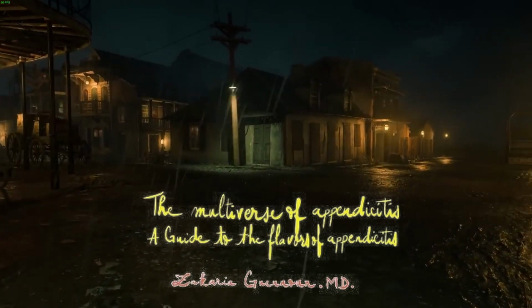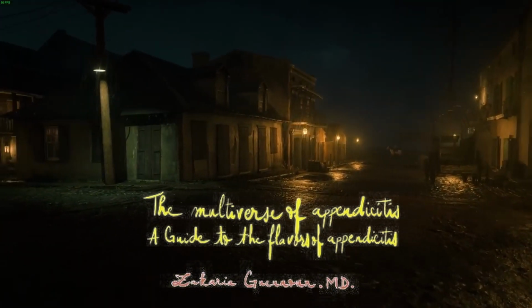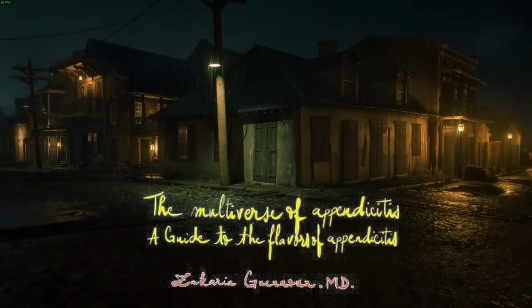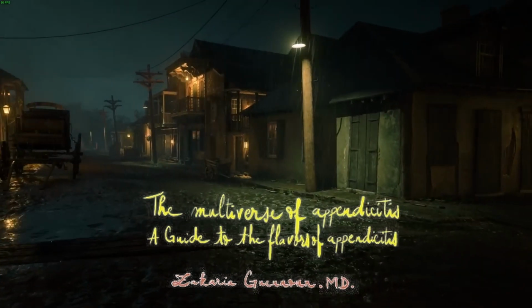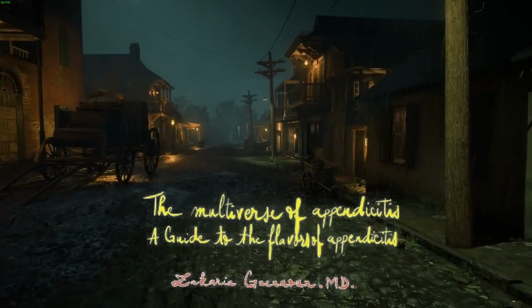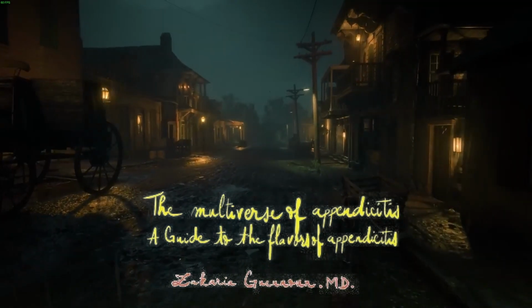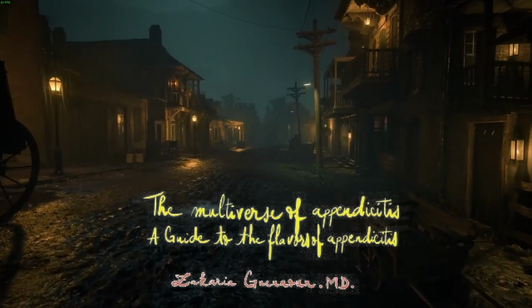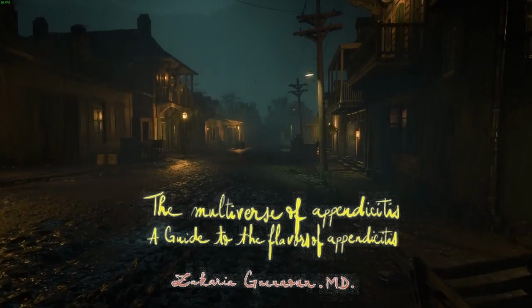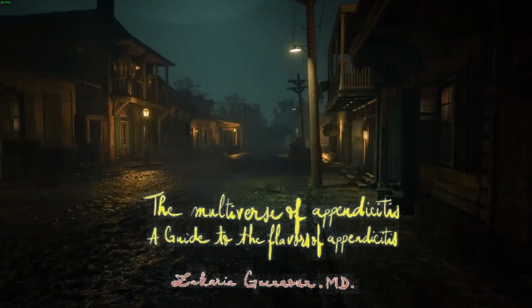Also, you have to bear in mind that you can rarely have appendicitis even after appendiceal surgery. In this case, the appendicitis will involve the stump, which means the residual appendix following appendectomy. Relatively few CT cases have been reported about stump appendicitis, although they are increasing in number recently. You will see an inflamed stump adjacent to the cecum and associated findings of cecal thickening, fluid, and abscess formation.